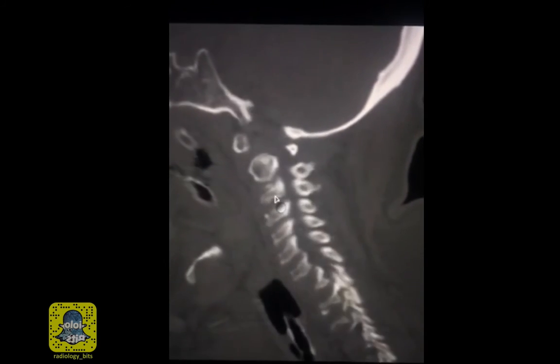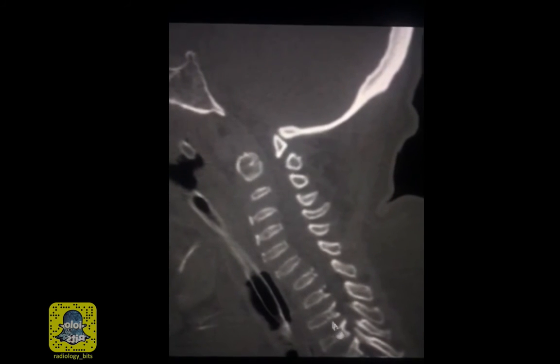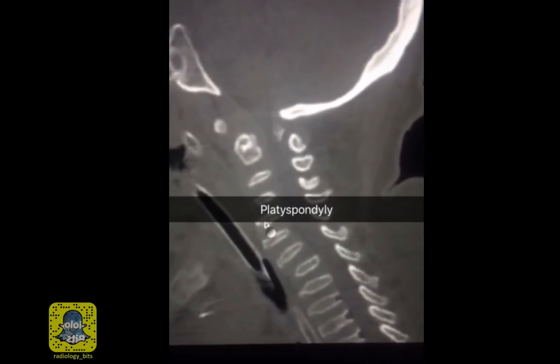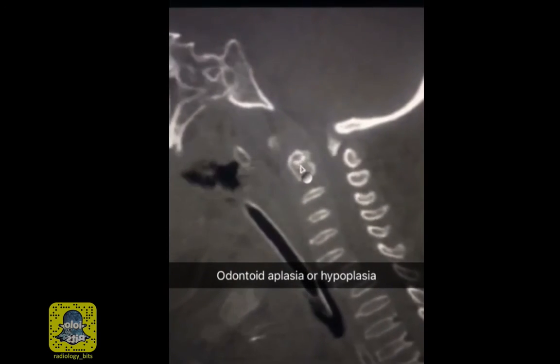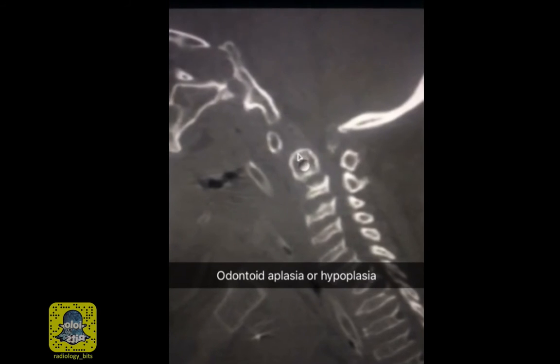Now to the spine. This really looks unusual. All the spinal vertebrae appear to be flattened. And this is what's called platyspondyle. Not only that, some of these vertebral bodies demonstrate anterior and inferior beaking, which is this pinpointing appearance. The second vertebral body should normally have a long odontoid process, which is not seen. So there is odontoid aplasia.